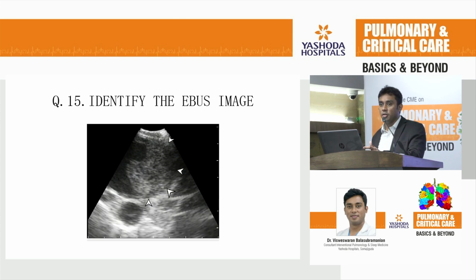Okay, last one. Did anybody get this answer? Okay, we'll ask from everybody. Which one? What is it? For TB. Which one? This one or the last one? This one. Where is the pustule in this? What is this image basically? What are you seeing? Which anatomical structure are you seeing? Which part of the lung, which part of the thoracic cavity are you seeing?